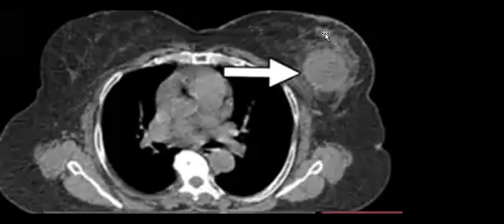And there is infiltration, maybe even skin thickening and so on. When you check the fused PET-CT image, what do you think? You think that it is a highly metabolic lesion. So it takes very high uptake. That's good. Now, when you interpret the spine, you find this appearance.